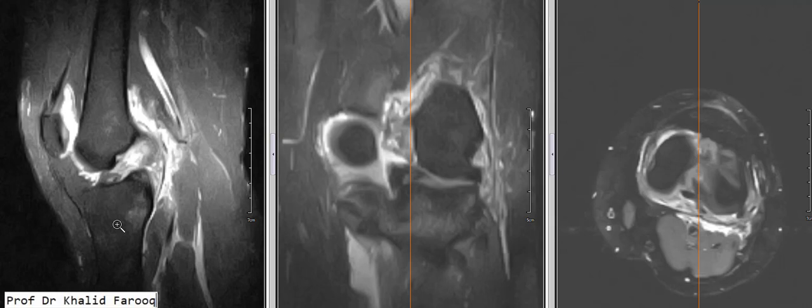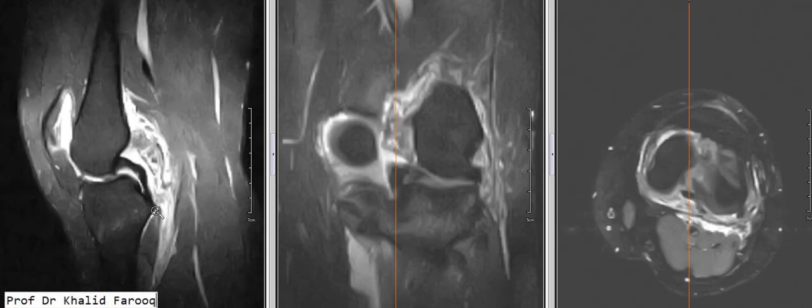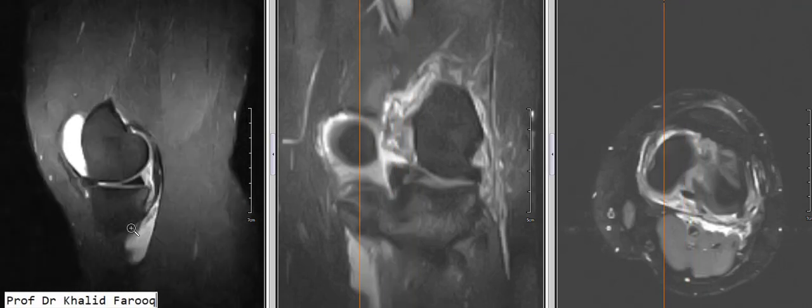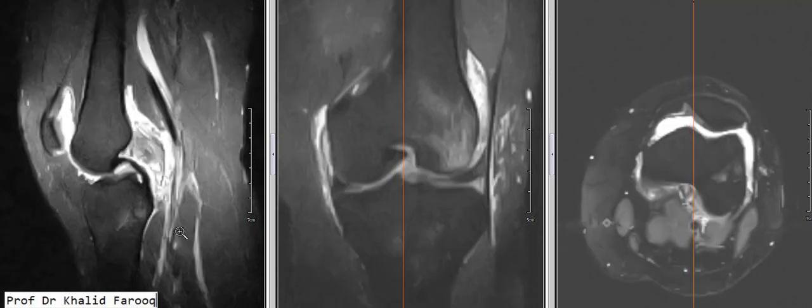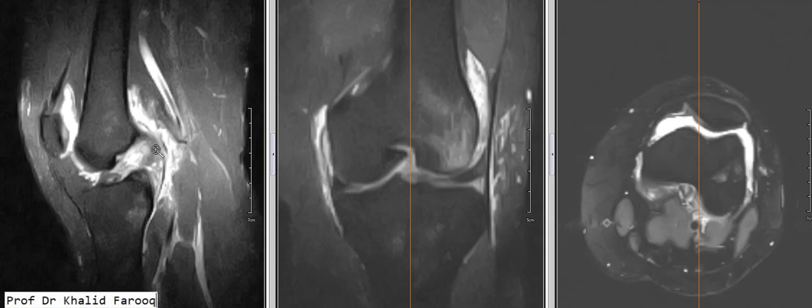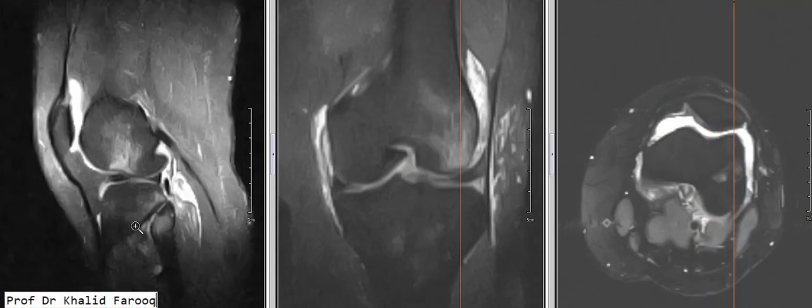So this is a case of acute total ACL transection, and we can see PCL is normal, and here we can see medial meniscus, anterior posterior horns, and its body appears unremarkable. Mild bone bruising is appreciated in medial femoral condyle. So in this case, we have seen total ACL transection, while PCL is normal. Both medial and lateral menisci are unremarkable.